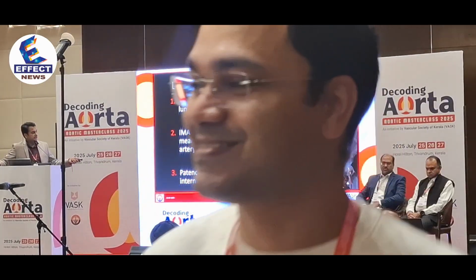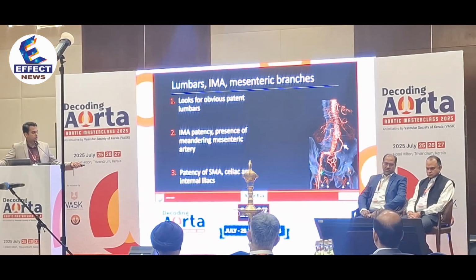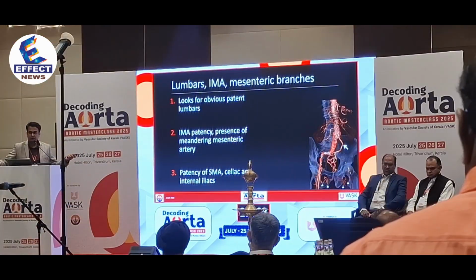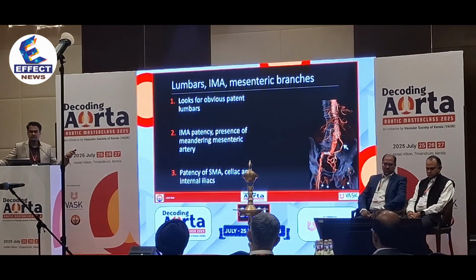So if you look at this particular example, the patient had bilateral occluded internal iliac arteries, and there's a large collateral coming from a prominent IMA going to the pelvis. So if you do not salvage this IMA, you would end up in significant pelvic ischemia.